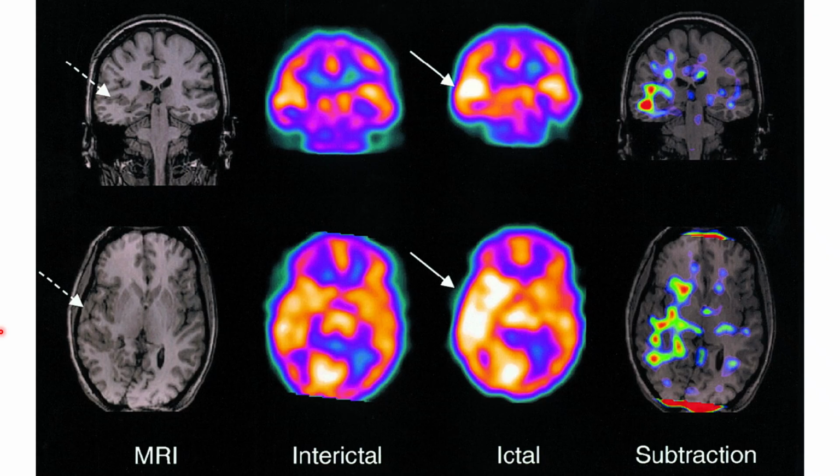And MRI gives just such amazing detail in the brain. You see the differences in white and gray matter. You see all the sulci and the gyri, and you can differentiate some of the different anatomy. Can't really do that with anything else. MRI is just really good for looking at that structure.